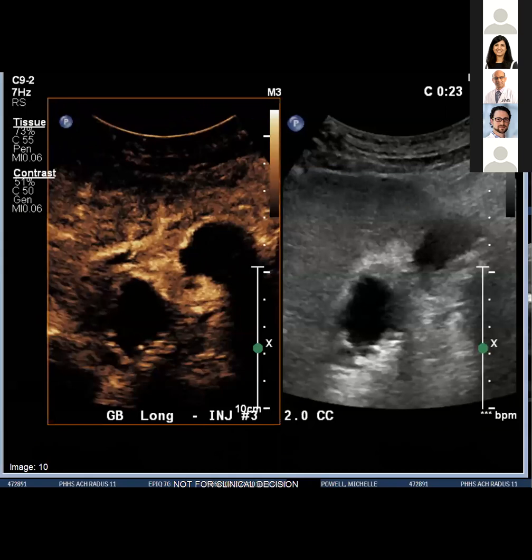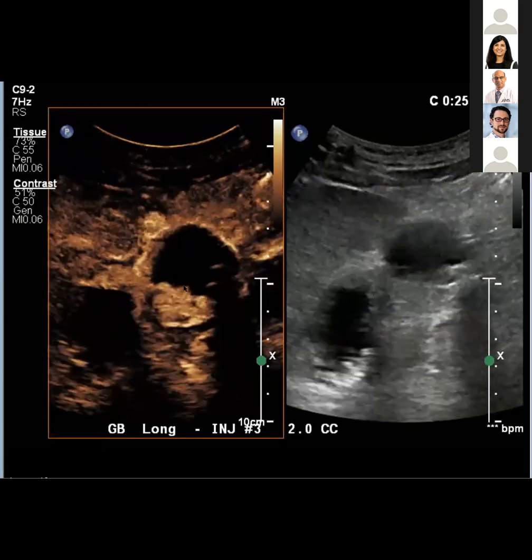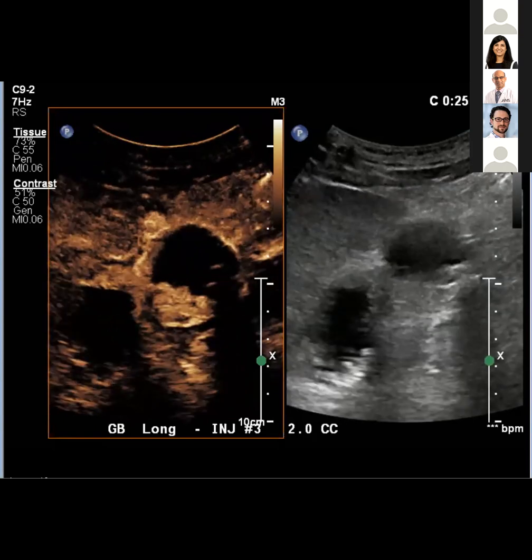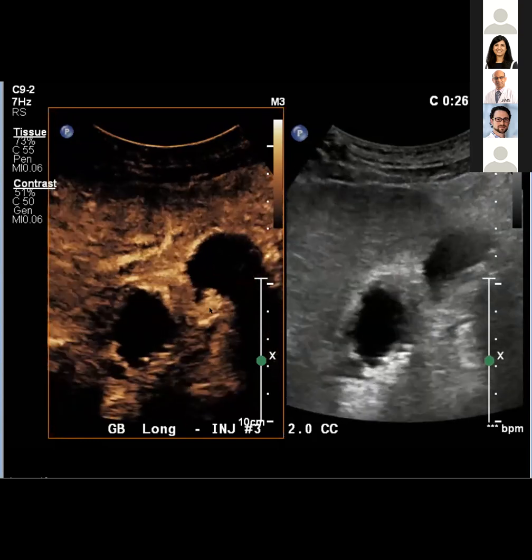Yeah, and so we've actually used this to verify whether or not there's an invasion of the liver. You know, this looks pretty, I'm going to interrogate these images a little bit better, but some of this lobulated stuff against the gallbladder fossa is a little worrisome. But obviously our surgical oncologists are going to take this patient and do an en bloc wedge resection of the liver to scoop out anything.